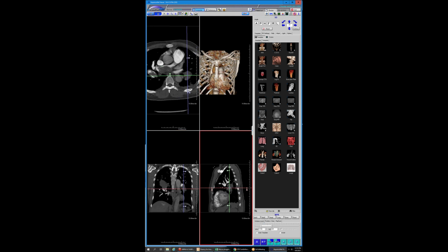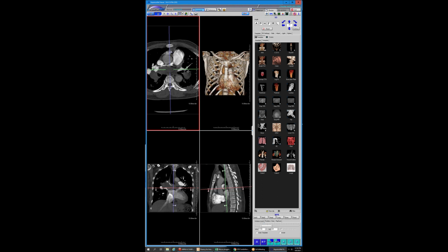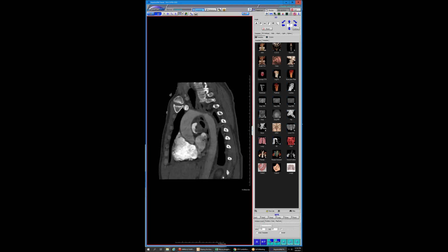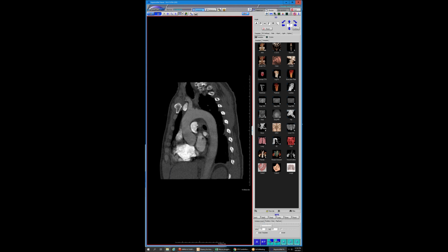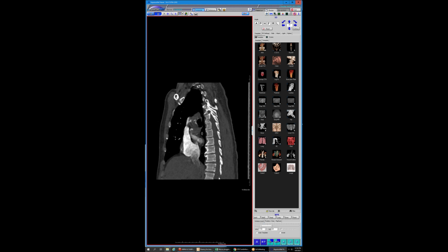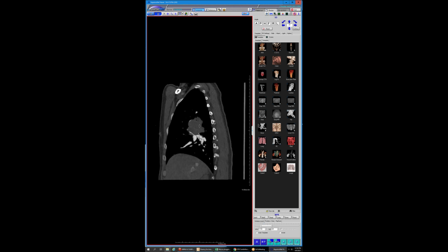And even the ones that look like they're really unilateral, if they're in the main PA, our surgeons will say, and they do say, that everyone that looks like it's localized to a single PA, or even extending towards one main PA, they're almost always bilateral when they scoop it out pathologically, because it grows along the intima. Even though there are these big soft tissue components, a lot of this winds up being tumor and clot. But because this grows along the vessel wall, you get spread along the wall of the vessel, even in areas that look relatively spared.